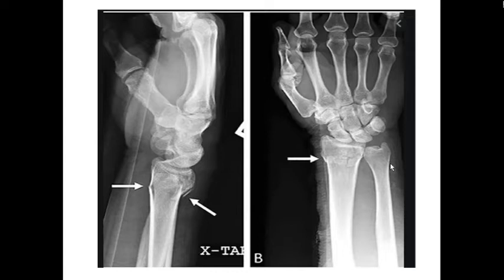Now you have to identify the X-ray. So I'll ask you one by one. Maybe we'll go group by group. All those who are from group 1, anyone who wants to answer can unmute themselves and say what they see in the X-ray.